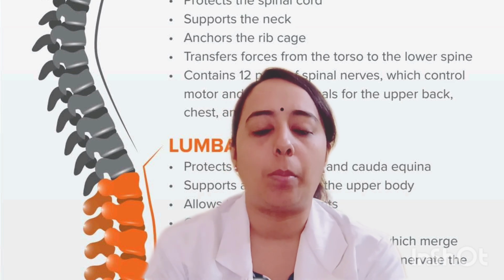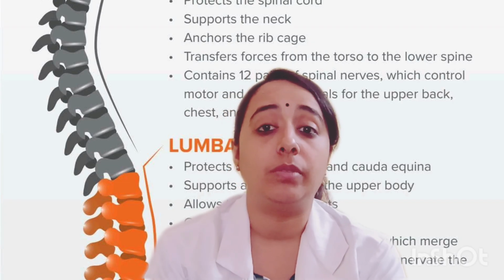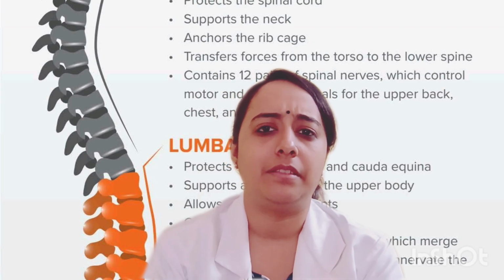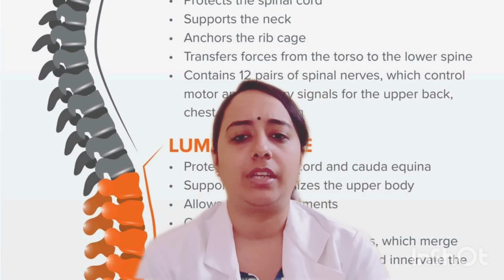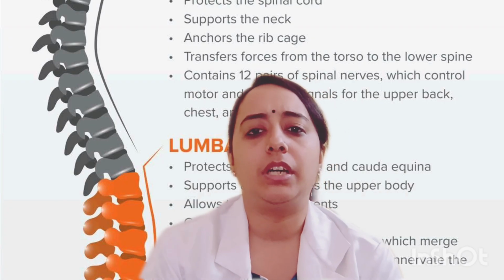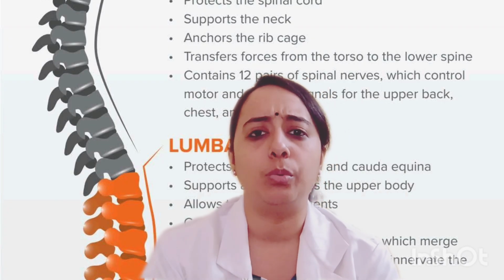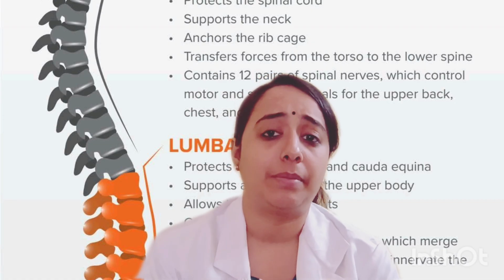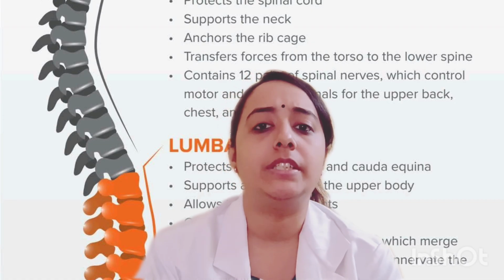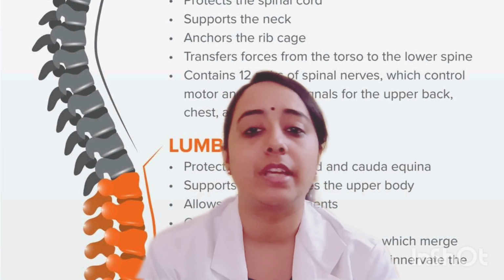So this is a very normal basic MRI of a lumbar spine, and the other part is the axial view, where you can see the white color and the nerves and how the disc is kept and everything. Axial view is a bit confusing sometimes because we have a little bit of confusion, like what happened to the disc, or whether there's enough fluid, and how the bones are kept. Now here we will get an idea whether the disc is bulged or herniated or whether it's a slip disc, etc.